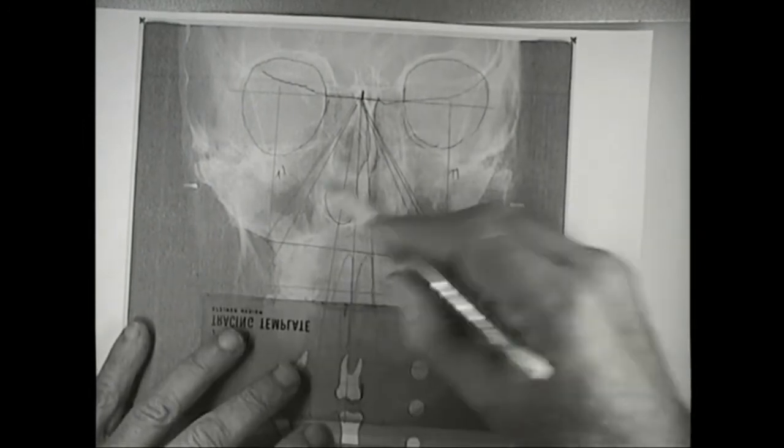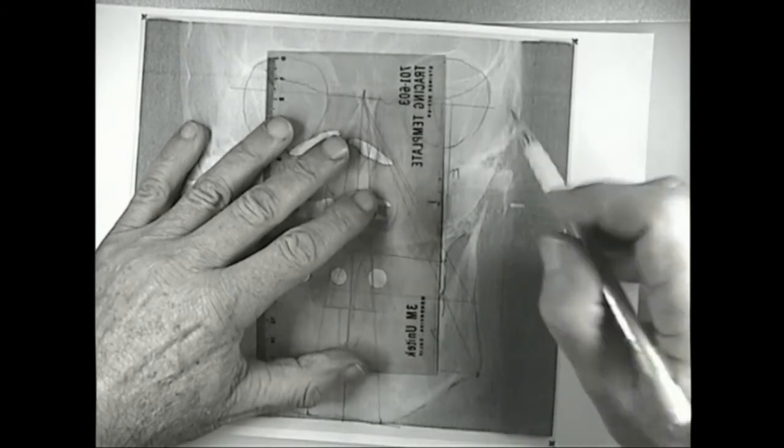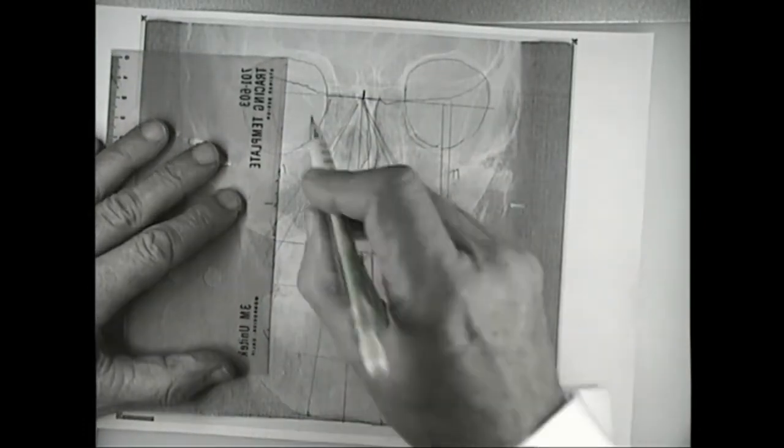So if ever you correct it, you've got to keep the midline in the middle of the face, unless you want to change it. And you know, at the time when we do the surgery, the contact point in the maxilla up there, we need to move it across, off the contact point, a little bit to the left. So I would now decide, there's a big difference skeletally, but dentally, I can't see the teeth that very well, but I can now see what's the discrepancy, and I can also measure that on my models.